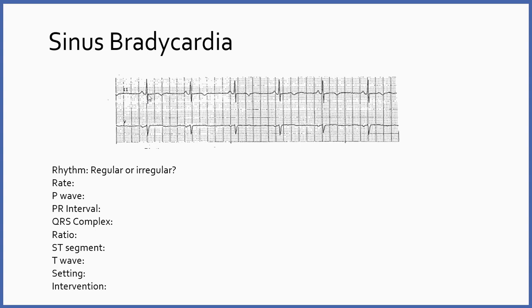All right, I got a QT interval of two big boxes plus a baby box, so 0.44 seconds. If you look at the last complex here, it's a little bit easier to see because the QRS starts on a line, and then we come back up just a little bit over, and that's where I got my 0.44 seconds.